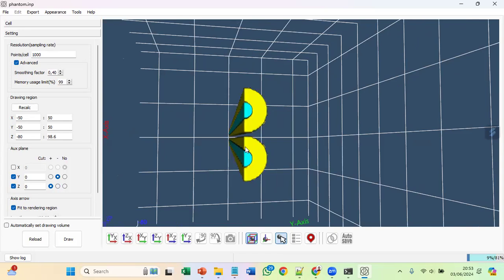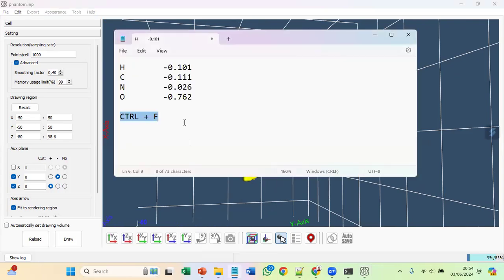Sir, do we need to develop the whole structure of the mouth and teeth too? If you still want to model the lip cancer, it depends. The way of thinking is like this.